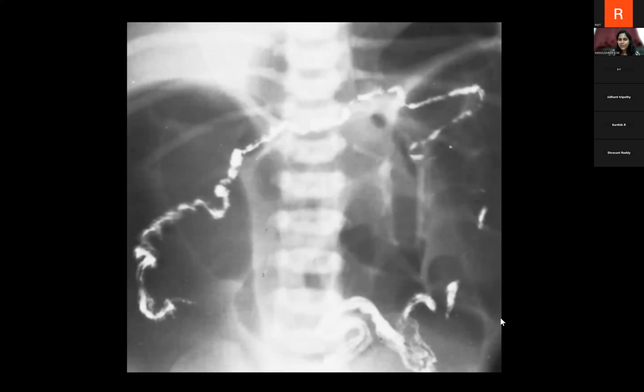Very good. I can already see the answer. So try to type completely, okay? Someone has typed ileal atresia and someone has typed microcolon. Can I get a combined final answer? Yes, it's ileal atresia with microcolon.